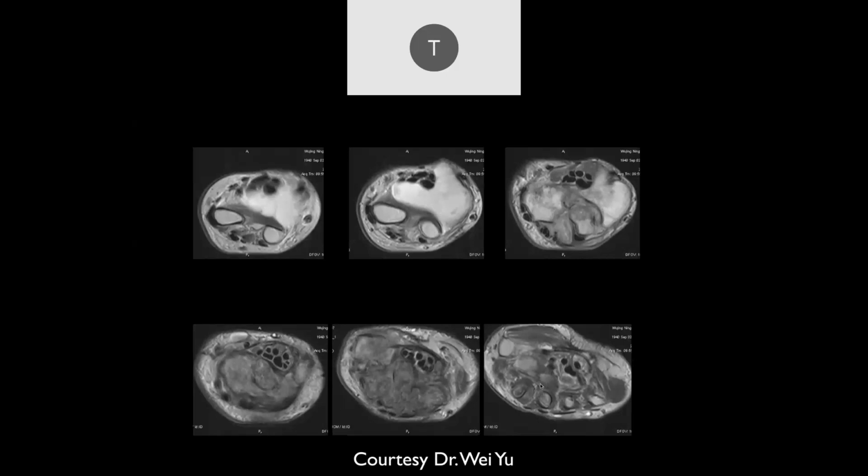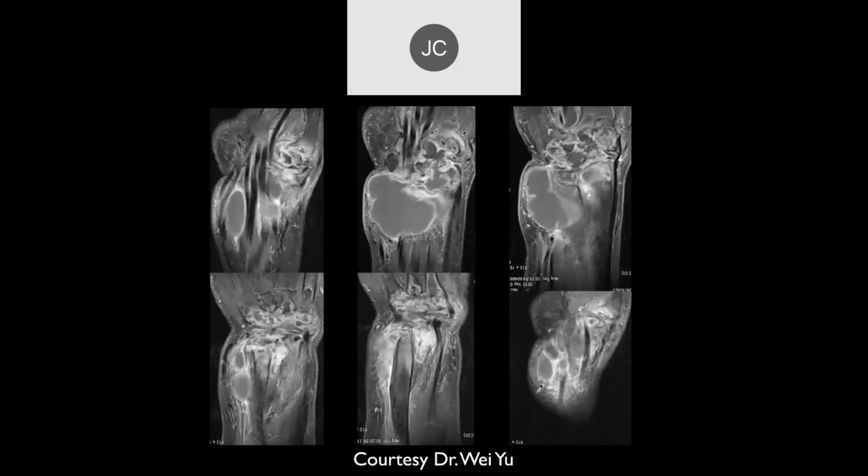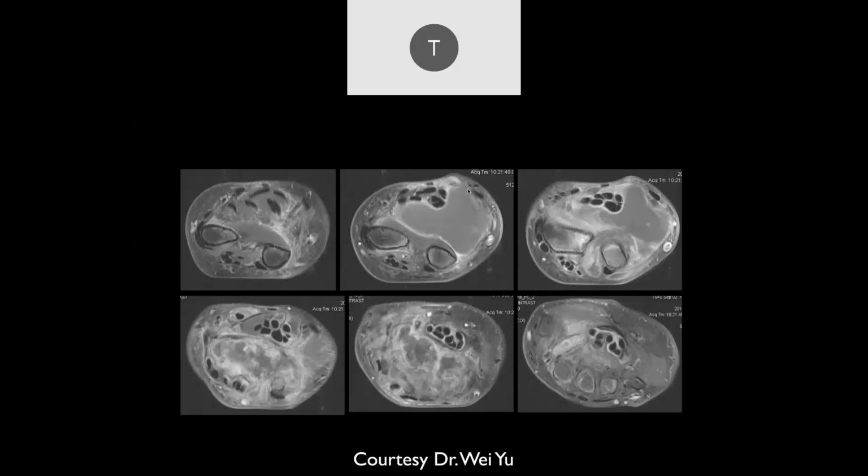So what are you thinking about? Well, actually, let's say it is an abscess and it's been around for 2 years. What are you thinking about? Tuberculosis or something. Yeah. So this would be a large cold abscess. And there you can see the peripheral enhancement, typical of abscesses, in someone who's not as sick as you would expect someone with a typical bacterial infection, and this was TB. Okay.